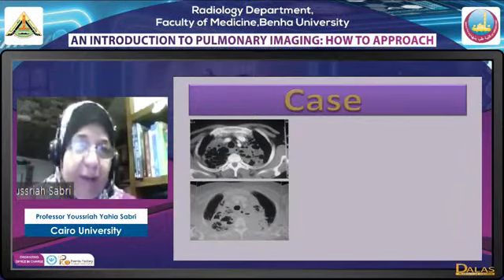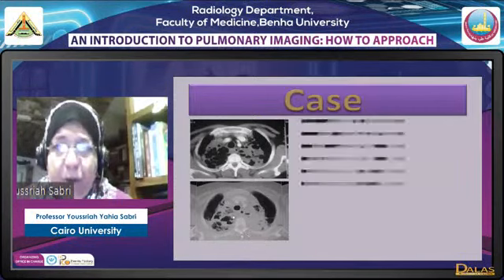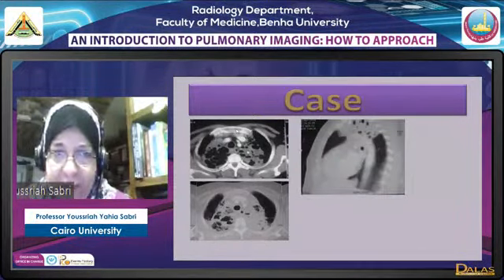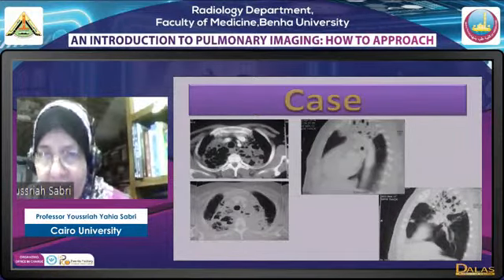Now we have a similar appearance on both sides with sharp demarcation. Sharp demarcation is a fissure, meaning I'm dealing with the whole lobe. So both upper lobes show cicatricial collapse. Doing a sagittal image to confirm, as you can see, the one with the heart is the left lung, the one without the heart is the right lung.